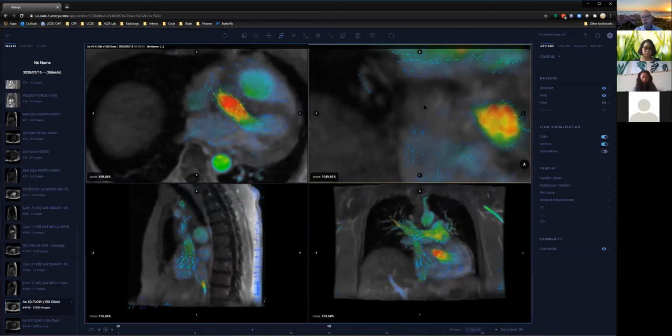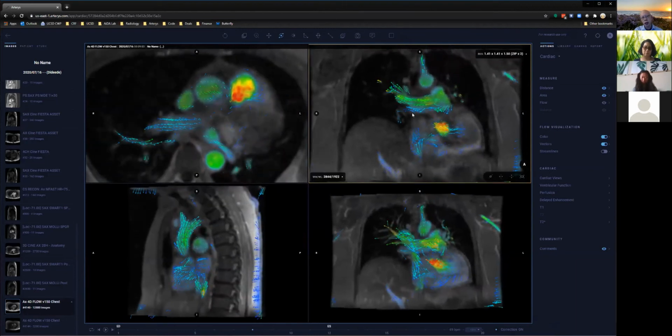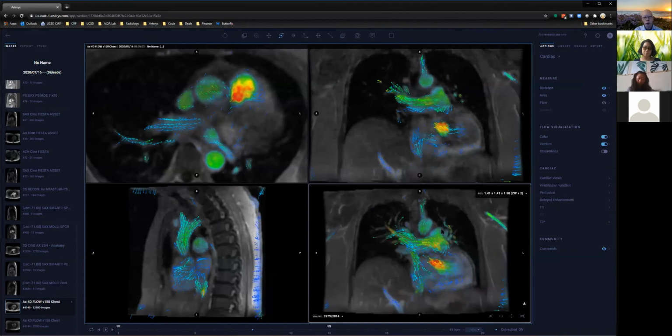This version of the 4D flow sequence that I use includes compressed sensing and parallel imaging in 2 directions. The parallel imaging in 2 directions, I don't drive to a very high level of acceleration, but it's typically roughly around a total acceleration factor of about 4, not super extreme.